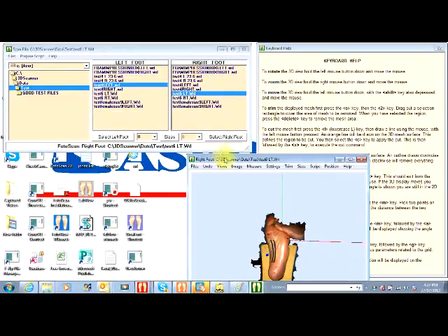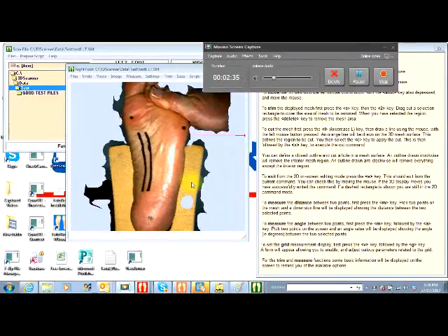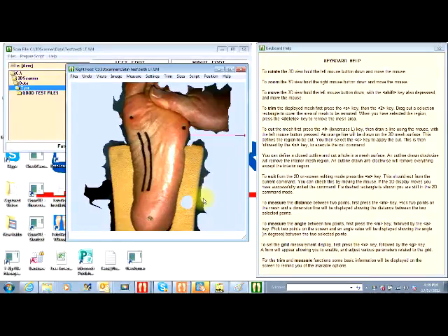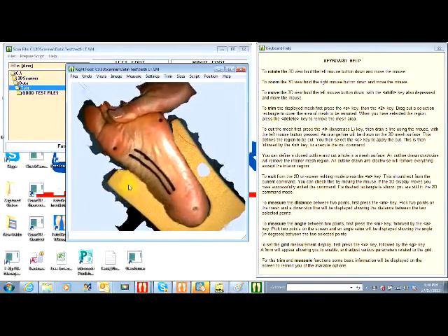Opening up that foot again, or another foot. If we do the same thing and we go L in an anti-clockwise direction, cut, execute, it'll take out the inside of the line. If you make a mistake and you want to cancel the command, E cancels it. Once you're out of it, you can move the screen around again.